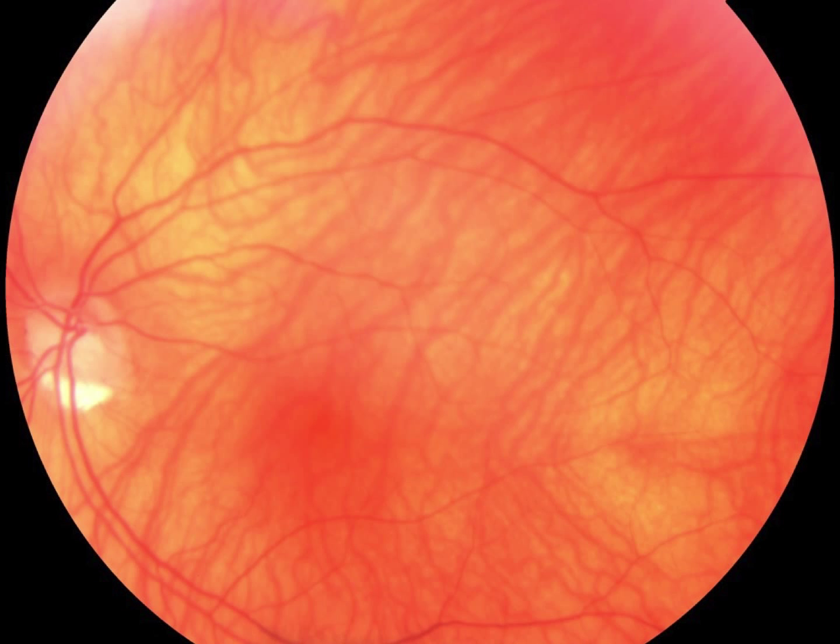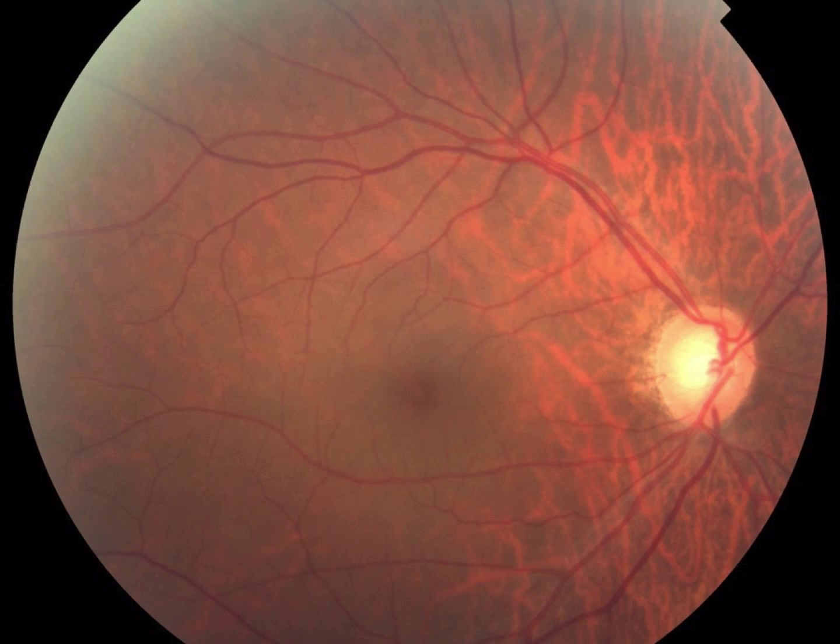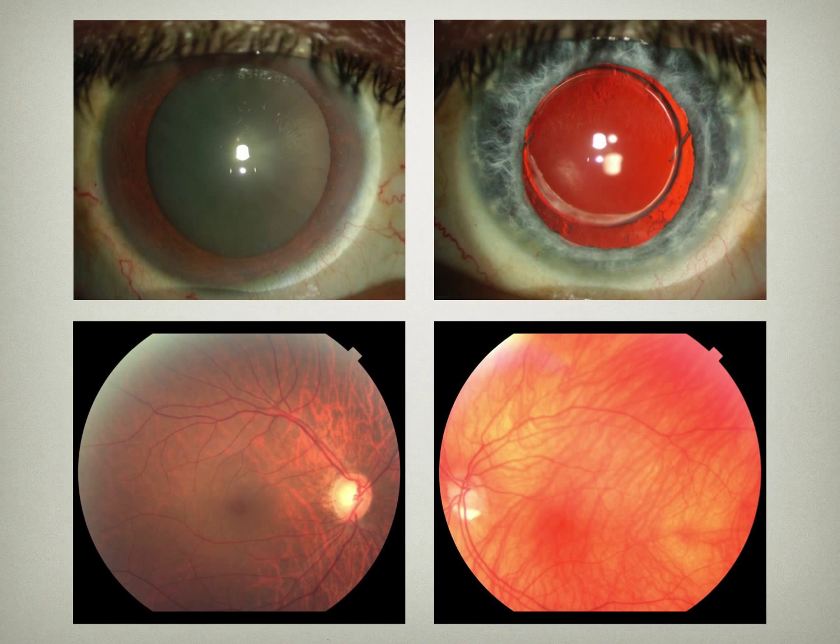So this is a patient that has a hypopigmented fundus. Look around, you see very prominent choroidal vessels. But then if you look at the other eye, it's pigmented. So this is obviously not albinism or albinoidism, but this is a patient that had this as well. He had a blue iris and a brown iris, and I guess nobody ever made much of it. So anyway, I thought it was really interesting.